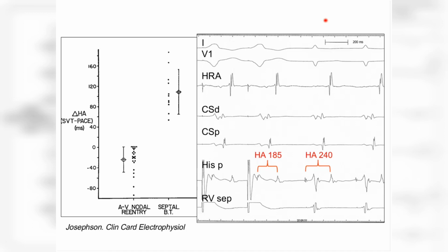Absolutely. So, go ahead. This is a very nice criteria because there is no overlapping, and I like it so much because of that. But probably you made a very interesting point, and that is that all these maneuvers that we do in the EP lab by stimulating are very, very useful in the case that only taking the sequences is not enough. Let's say, to differentiate a typical intranodal tachycardia from accessory pathway tachycardia mediated by a posteroseptal or paraseptal pathway can be very, very challenging. And in these cases, the sequence of activations probably is not all.